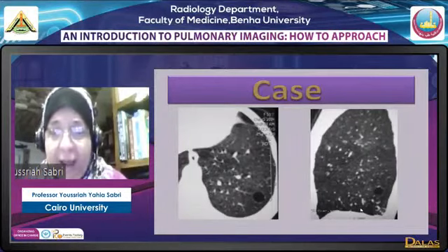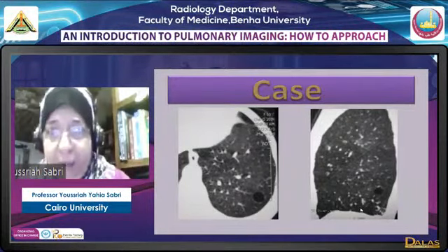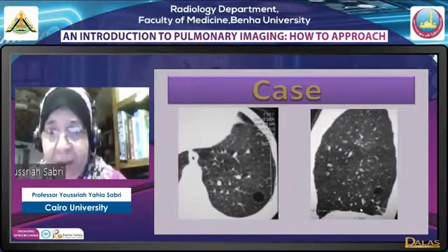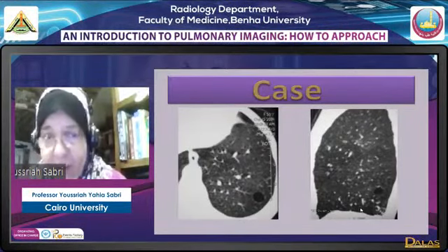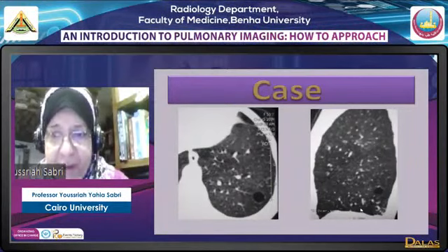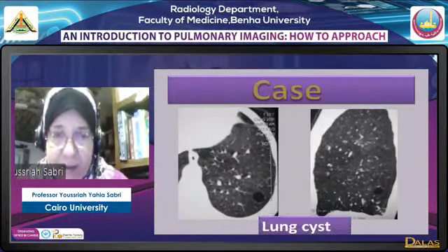You measure it, and you say, where is this? Could the lung's air-containing cyst be congenital? Yes. A bronchogenic cyst in 15% of cases can be a solitary lung cyst, and it will be air-containing, not like the mediastinum where it is fluid-containing. Okay? So it could be congenital. A bronchogenic cyst could be congenital. Cyst here, this is a lung cyst.